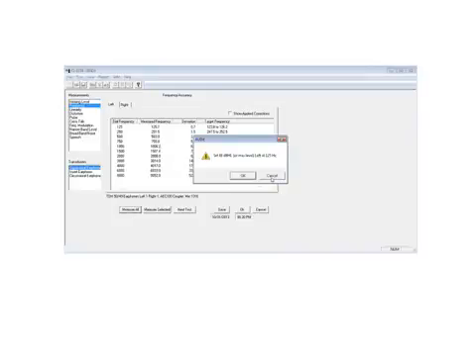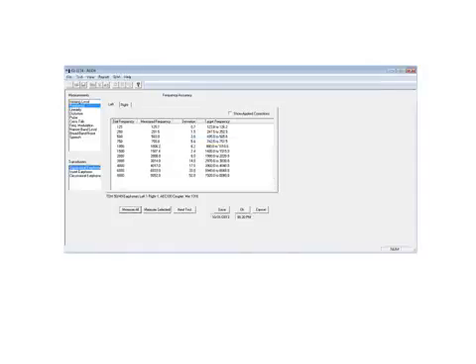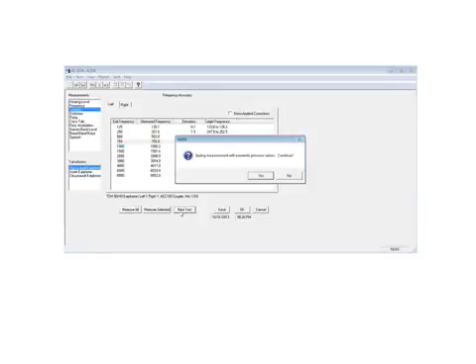At this point, I think we'll bypass that. I think you're starting to see how it's mostly a step and repeat. If one item fails, you can go back and mark that particular item and do a measure selected to home in on that particular problem at that frequency. But as you'll note here, we'll go on to the next test.